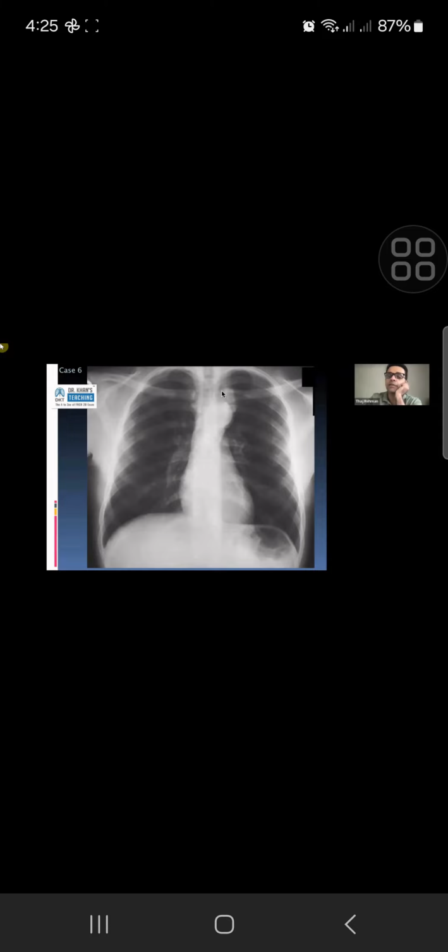But the description was fine, widening of the mediastinum on the left side, and that description of a lucency between the spine and the lesion, again, not clear. There is a bit of lung air on the top of it, but it's just got an obtuse or broad base to the spine and to the mediastinum. You can't see a lung outline between the lesion and the mediastinum at all. So look for subtle rib erosions, rib notching.